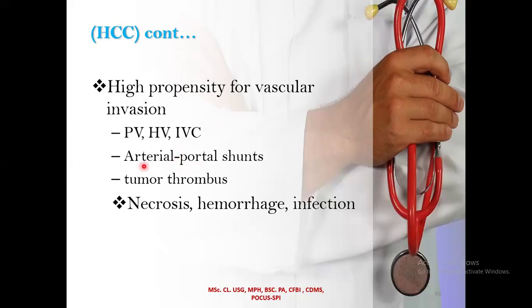Arterial portal shunt. So as I said, it can create a hole in an artery and then a portal vein, like a hepatic artery and portal vein, and there will be a shunt from the artery to the vein. It shouldn't be so.